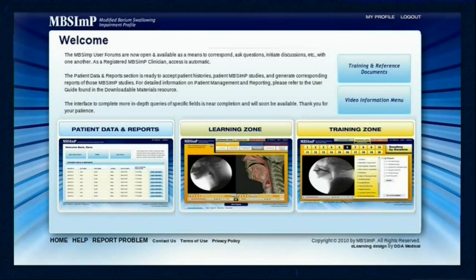Completing the educational zones and passing the reliability testing is only the very beginning of all that the MBSImP was designed to be. Once the testing is successfully completed, an important and very functional section of the MBSImP becomes available, the Patient Data and Reports section.